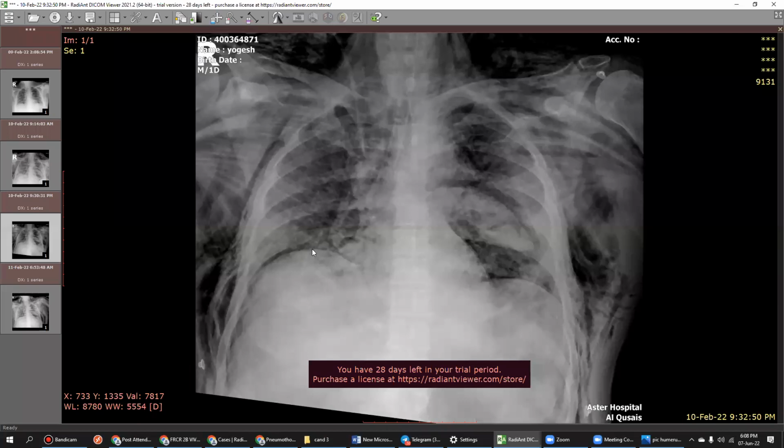In a case like that I am searching for any fractured ribs, which I could not appreciate clearly in this view. There is an endotracheal tube noted, which appears low in position and going to the right main bronchus. So I inform the referring physician for repositioning. Right central venous line also noted in a good position.